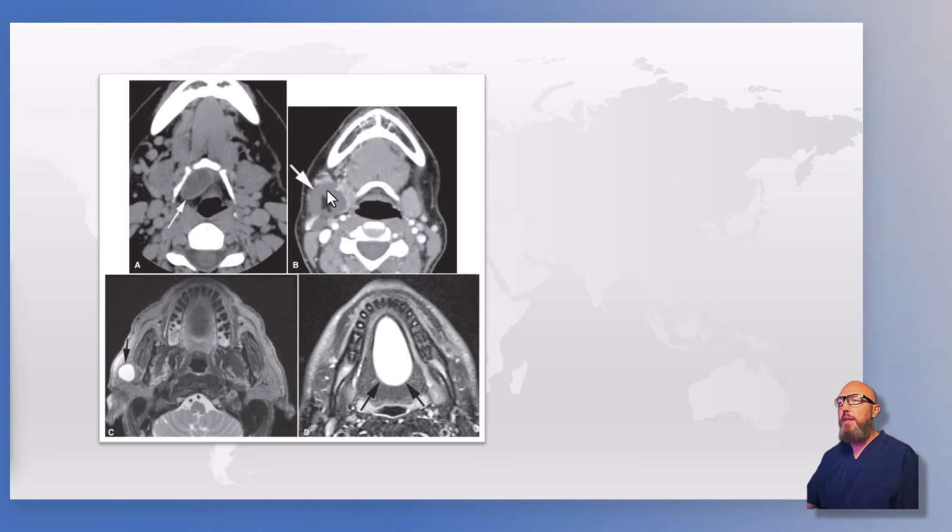And then this one is off center, so it's lateral to the airway. Just for comparison, we have the submandibular gland right here. In this case, it's kind of squished over here to the middle. And so what did we say more in the lateral neck? That's your branchial cleft cyst. And this one, compared to the other ones, is relatively small, but still very sac-like, very fluid-filled.